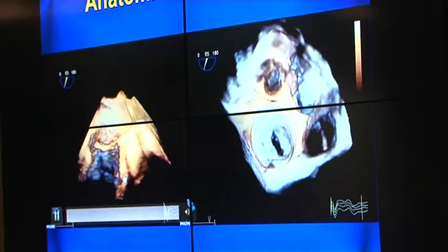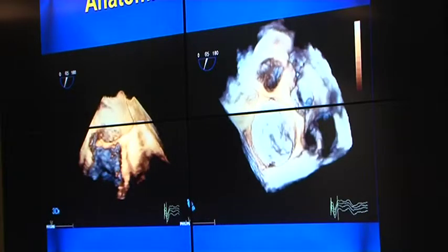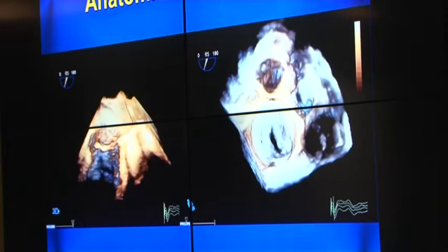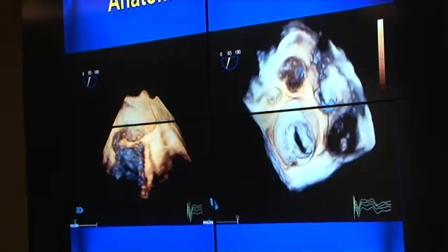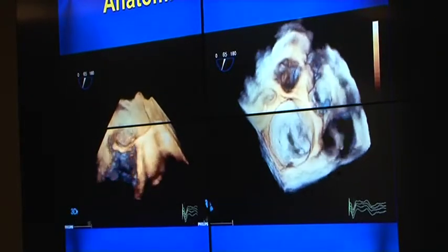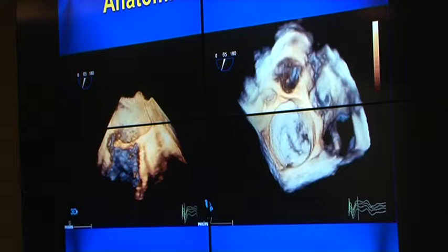It is very important when you use 3D, because if you don't have many landmark points in your volume, because you reduce the size of the volume to increase resolution, you will get lost in space. If you don't have landmark points or have only a few you will get lost. But if you know how to produce anatomical orientation, you will get where you are, okay?